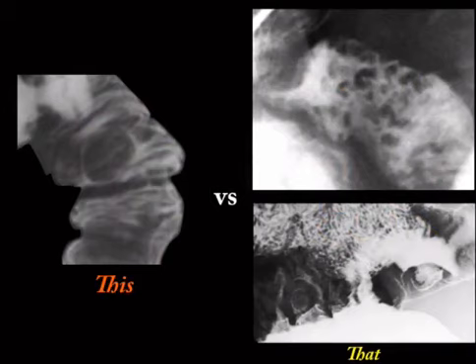So we're out of the fold thickening, and now we're into the filling defects. So filling defects come in two categories for the purpose of multiple choice. Two basic categories. We've got focal or single one, or we've got multiple or numerous ones. And there's a broad differential, but for the purpose of multiple choice, it's easier just to remember one thing.